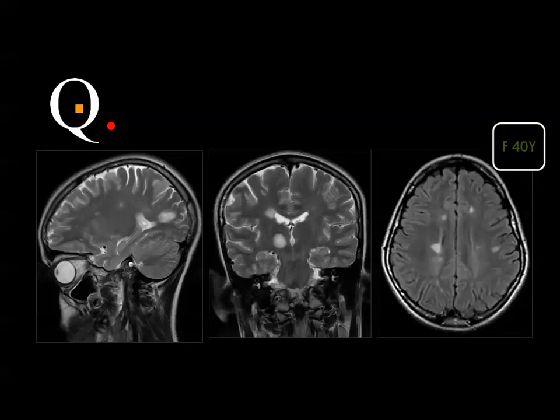And you have to say first, what is this examination? Please. CT scan, sagittal. CT scan, this is not a CT scan. If you say CT scan in the exam, you will lose half of the mark. Okay? And this is MRI of the brain, T2 weighted images, axial, sagittal, and coronal.